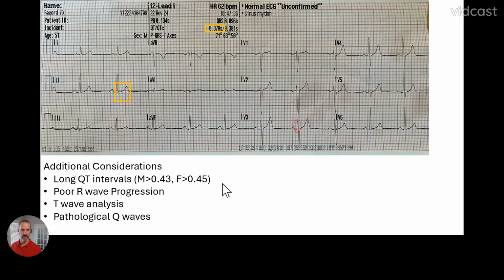All right, moving on to the next one is your R wave progression. Very simply, look at lead V3, and if it is 3 boxes or more in height, it indicates that the person has a normal R wave progression. And remember, in and of itself it doesn't mean a whole lot, but if a person has poor R wave progression combined with symptoms of acute coronary syndrome, it could be an indication that they are having a heart attack or there is an evolving heart attack. So it is something that you want to look for.